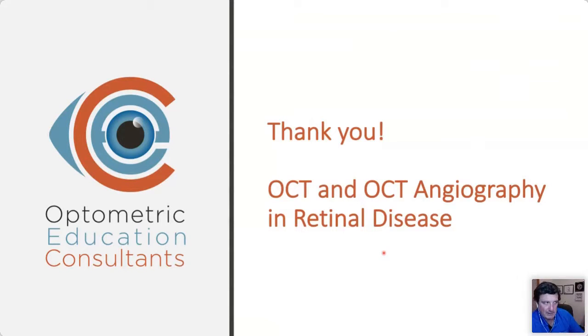So it's diabetic retinopathy. You're not billing dead people, Greg. You're using technology at a high level. You're showing me foveal avascular zone changes. It's minimal to mild. It's not severe. So you're not going to see the patient back every 2 months, but you're going to see the patient back and coach them appropriately and really help get the PCP and their hemoglobin A1C down.